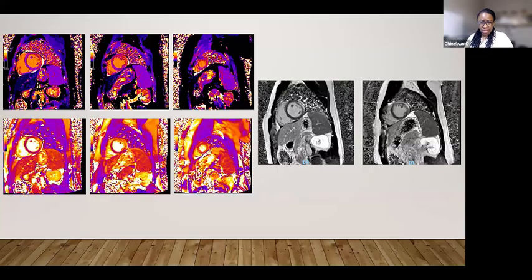It wasn't moving as much as the others. They weren't all normal, but the lateral wall was quite hypokinetic. So T1 time on the anterior septal and inferior wall is actually normal, but on the lateral wall, it's not. Now, T2 time, basically for our scanner, was about 45 to 50 milliseconds. And again, it should be about purple going into red, which his anterior septal and inferior walls are, but then the lateral wall is quite brilliantly yellow, quite elevated. I think the T2 time here was as high as 60 milliseconds. It was distinctly abnormal, as was the T1 time.